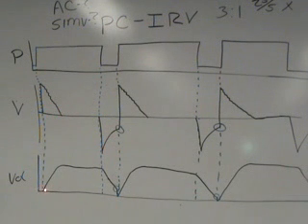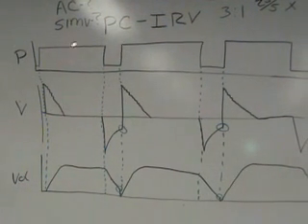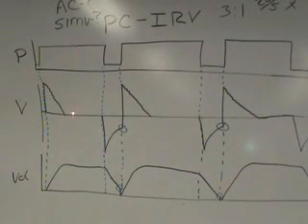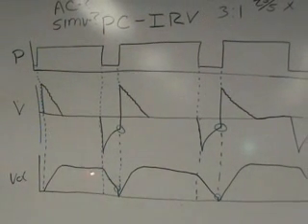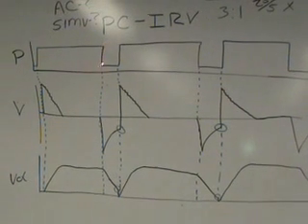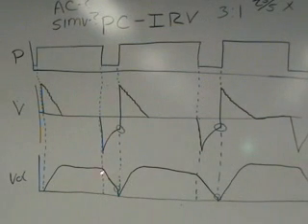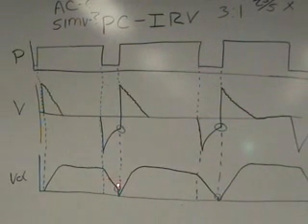If I look at my volume scalar, my volume goes in. The amount of volume that's going to go in goes in at the point that the flow decelerates to zero. No more flow is going in during this point because the two pressures, the alveolar pressure and the ventilator pressure, have equilibrated. At this point, at the end of my I time, the patient's allowed to exhale. So you see expiratory flow coming out, and the patient's exhaling, and the volume's coming back out of the patient.